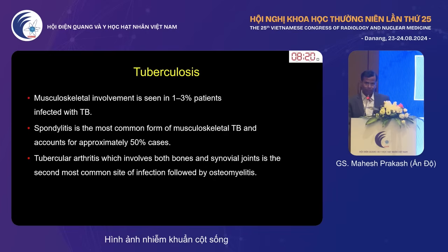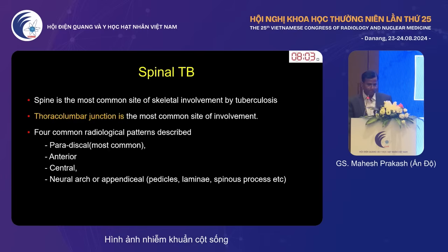We know about tuberculosis. Tuberculosis is very common in Asian countries, particularly in the endemic regions. The pathogenesis is nearly similar, causing spondylodiscitis as well as collections in the pre- and paravertebral locations. So what are the types of this TB? It can be of 4 types actually, so I'll show you an example of each case.